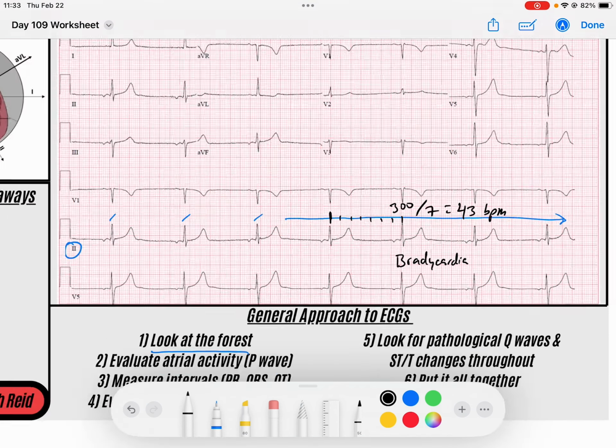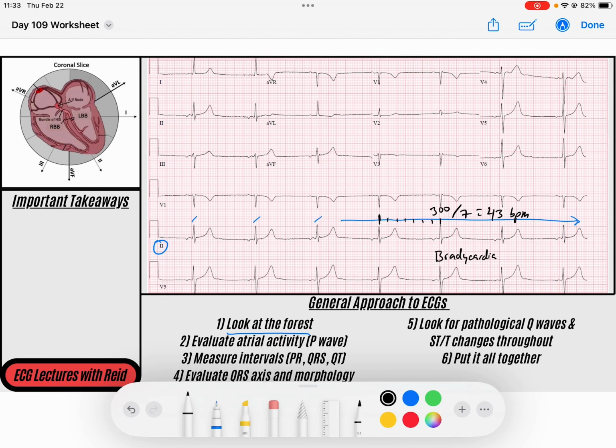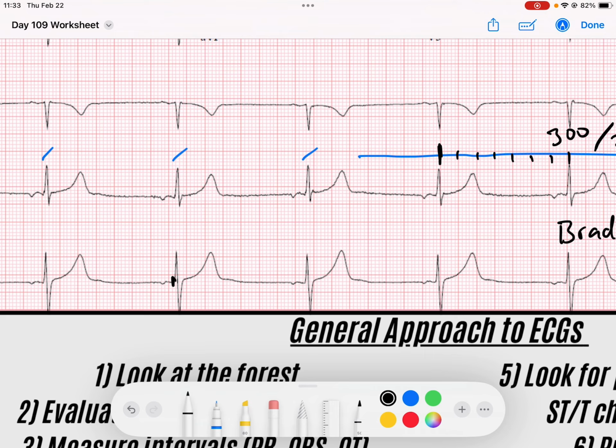and it appears that it's a bradycardia that's originating at least from the AV node or higher, right? Because it's a narrow complex bradycardia. It tells me that we're using that His-Purkinje system of rapid depolarization if the duration of my QRS is narrow.